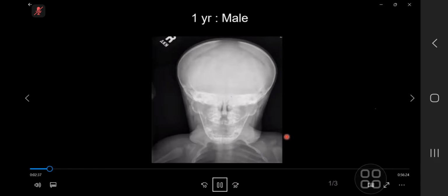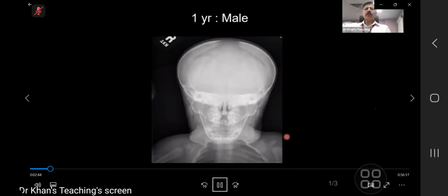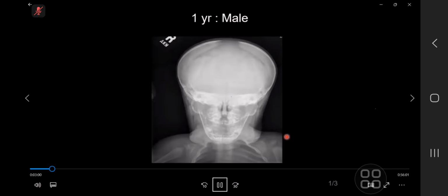Yeah, the chest wall seems abnormal too. That's fine. That is a correct observation. But I was saying anything else in the differential diagnosis from the congenital world. I don't have anything on mind.